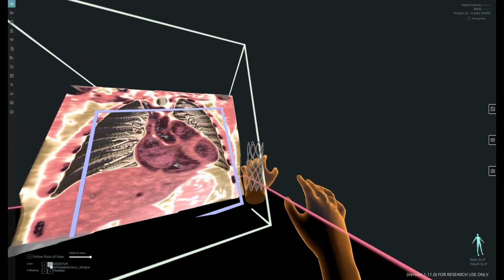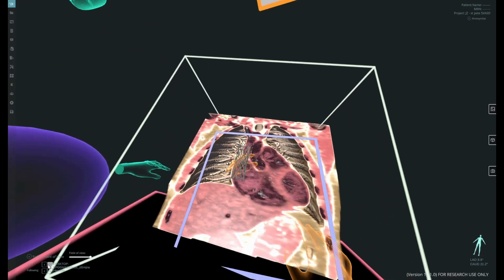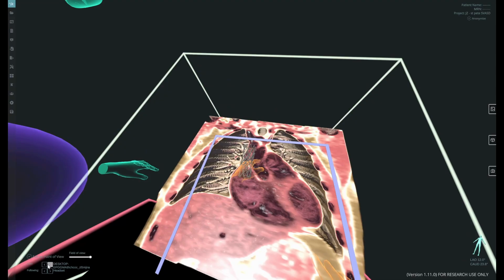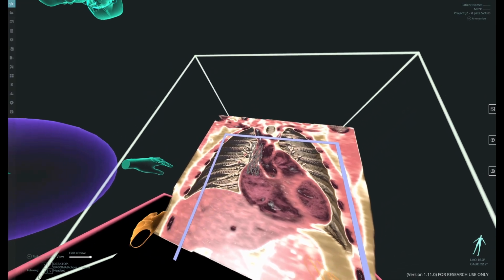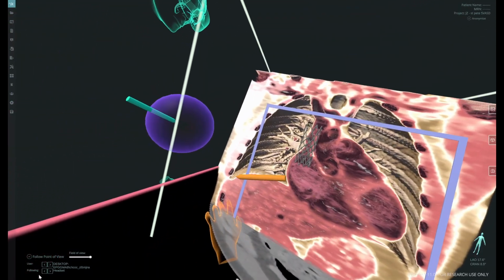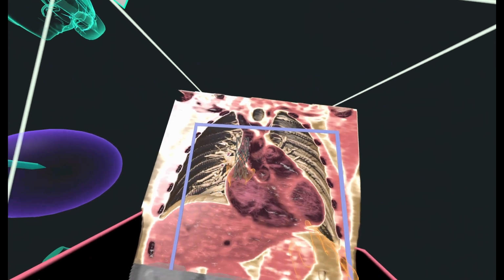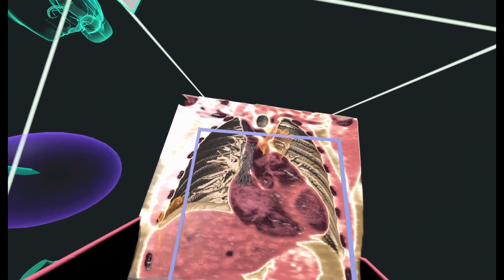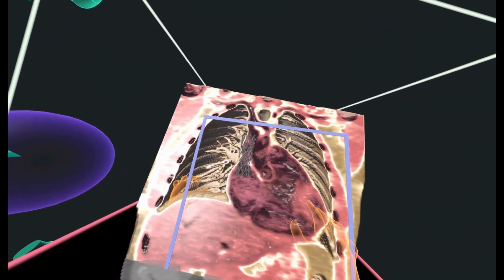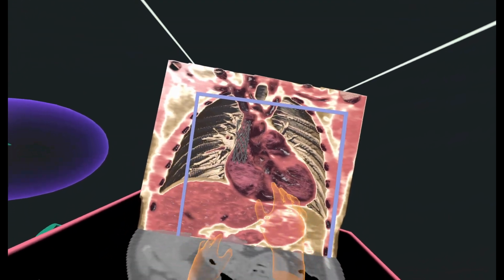I'm going to bring the stent into the SVC and see that that most likely is what we are going to use, given that the SVC is very compliant. But I'm going to decrease a little bit to make sure. There we go, I like that better. We have the innominate vein up there, and we know that we use that as an anchor in many patients of this.